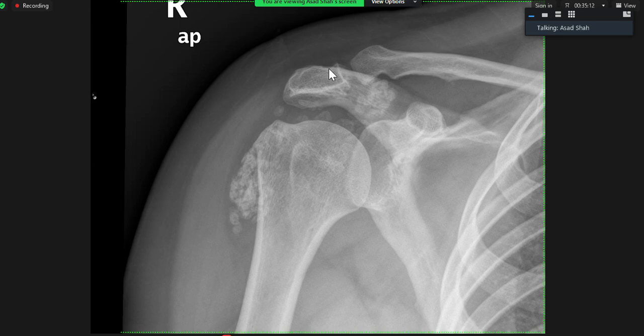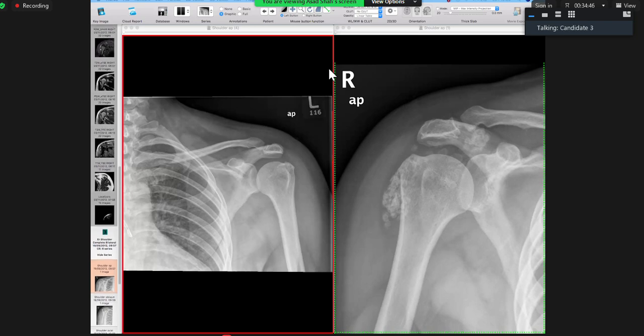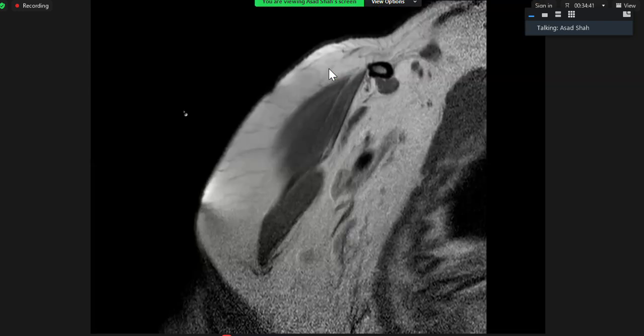Why tuberculous arthritis? The joint is fine. So the other possibility could be tumoral calcinosis, but it is less likely. Is it around the joint? Yeah, it is around. It's on the extensor surfaces, basically. So let me show you the MR then. Why don't you scroll it for us?